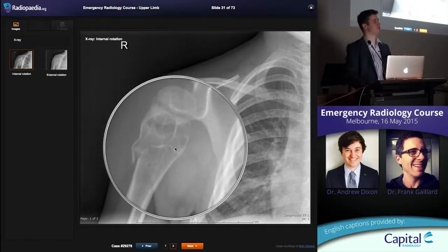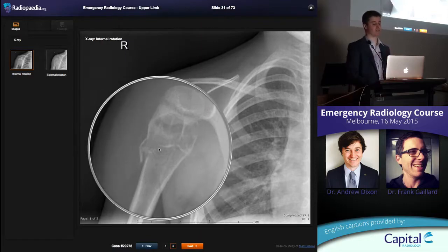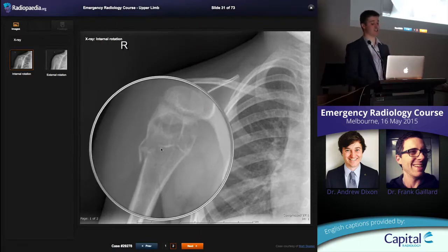Most lesions in the bone, like a metastasis or Ewing's sarcoma or all these other things, are solid tissue, okay? And if you break it, the bone can't fall down through the lesion. This one here is full of fluid, so when it fractures, it's just a simple cyst. When it fractures, that bone falls down and sits in the bottom. So if you get one of these presenting in ED and you spot the fallen fragment sign, you'll look awesome because you've picked a unicameral bone cyst.